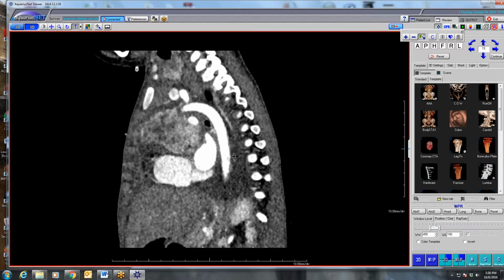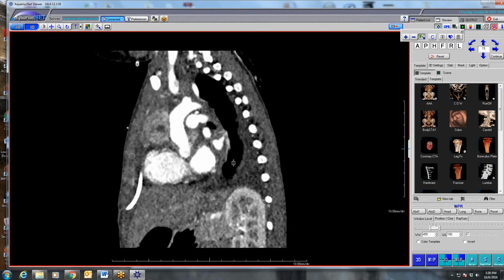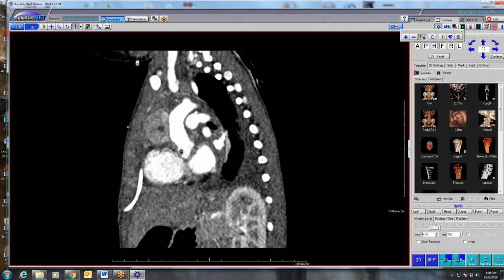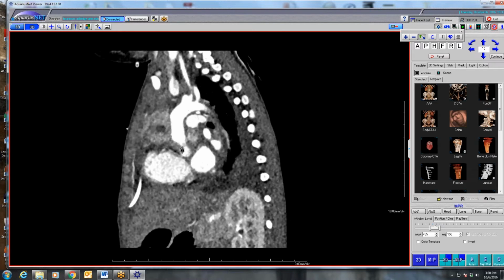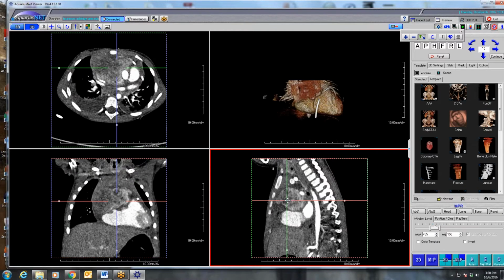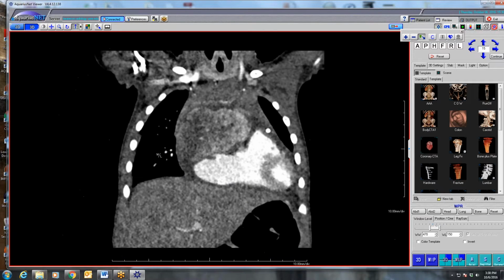The question is, it's intrapericardial. That's for certain. The meat of it is within the pericardium. When I say in the pericardium, I mean deep to the pericardium, not between the two mesothelial layers of the pericardium. So it's not a tumor arising from muscle itself.